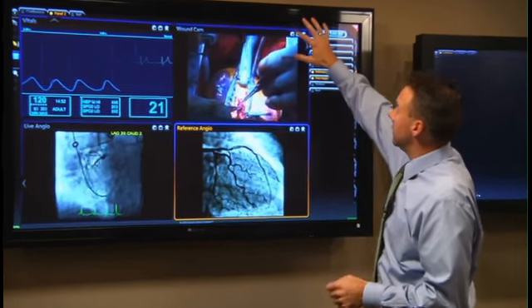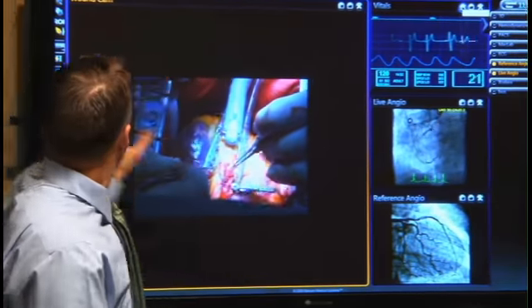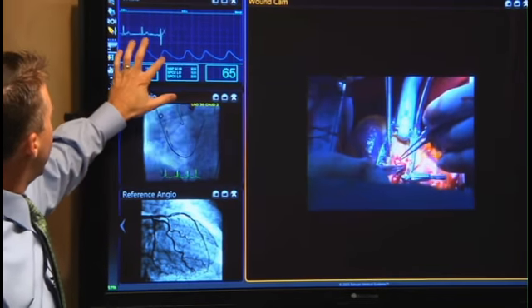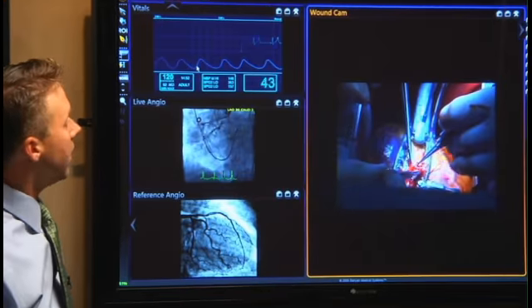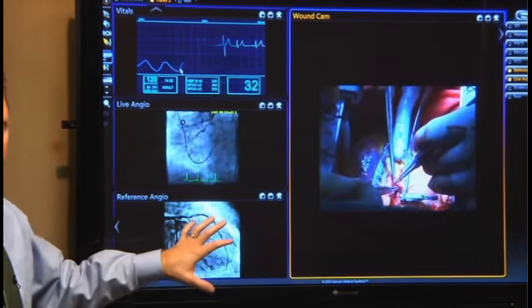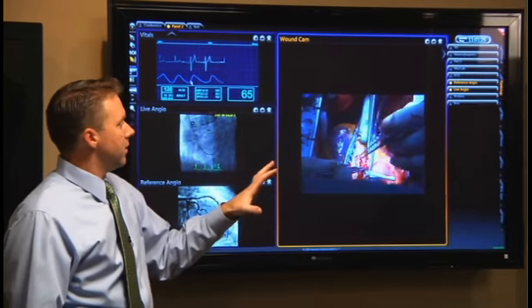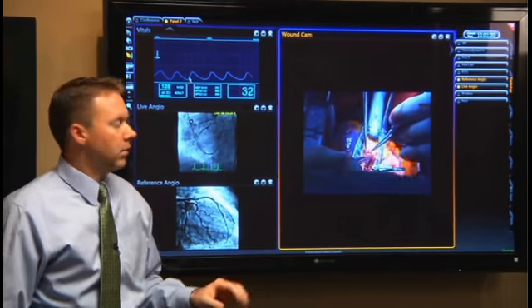So if I would like to change the format of this, move these formats around so that I can have a little bit more flexibility, I can change the height and width of these on the fly. This can all be done right out of the box with ControlOR. Automatically now we have already encompassed about 90% of the functionality that I showed you over there.